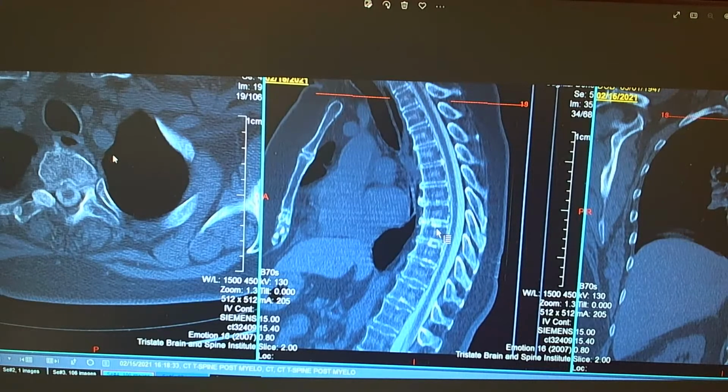Yeah, it could be esophagus, but it would be unusual to have that much air in the esophagus. Most of the time, you don't really see the esophagus, except if you have an esophageal tumor. It is hard to see. We have a cadaver lab, and I showed that in one of our cadaver labs. Ask Amanda to give you access to one of those videos. The esophagus is very flimsy, and unless you're putting a lot of air in it, 99.99% of the time it is a thin line that is extremely hard to visualize.